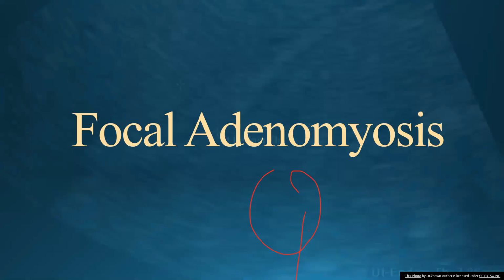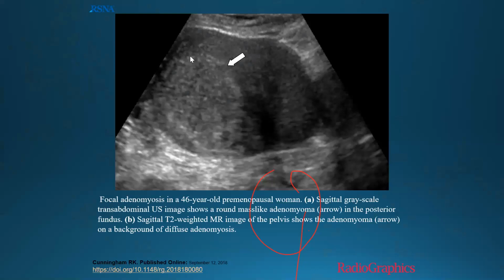So I'm going to talk about the focal adenomyosis. This is a picture of a focal adenomyosis. You could see here how it's very well delineated in a 46-year-old woman. This is sagittal gray scale, and there is a round mass-like adenomyoma. There is no capsule here. That's an adenomyoma. It's not a fibroid. I'm going to show you another picture for the fibroid, but this is in the background also of diffuse adenomyosis.